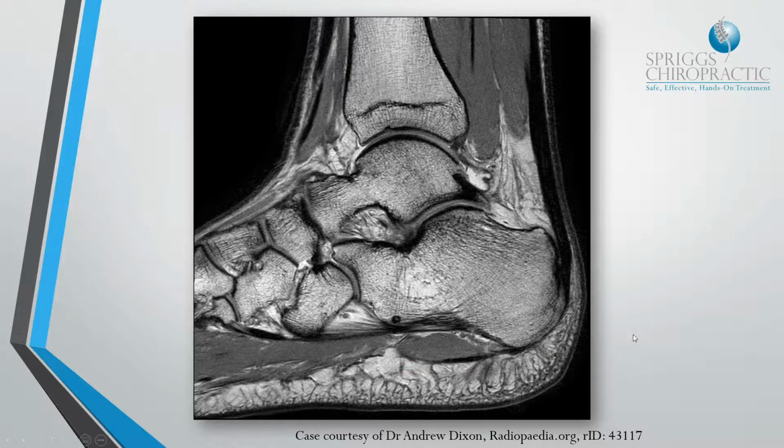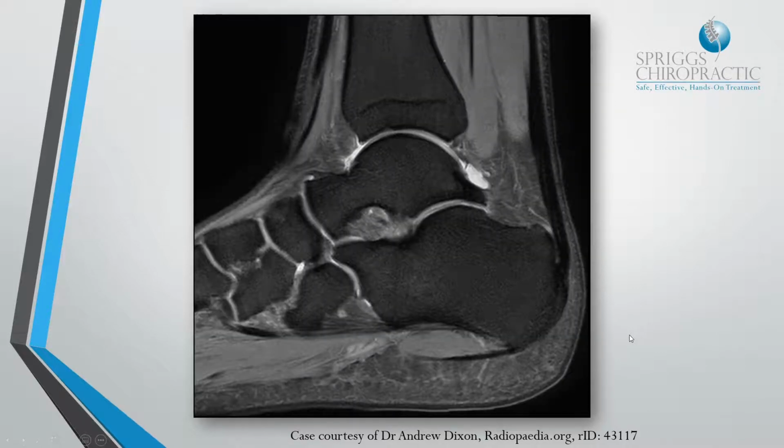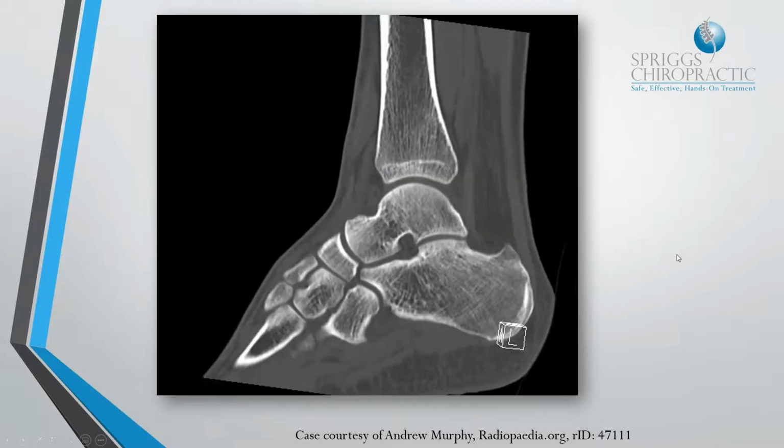So you get a high signal return from a T1, whereas a T2 will suppress the fat, but you'll be able to see the water. So the synovial fluid within the joint margins shows up really nicely. So again, it's a great way for evaluation of, obviously, especially bone edema following a trauma.